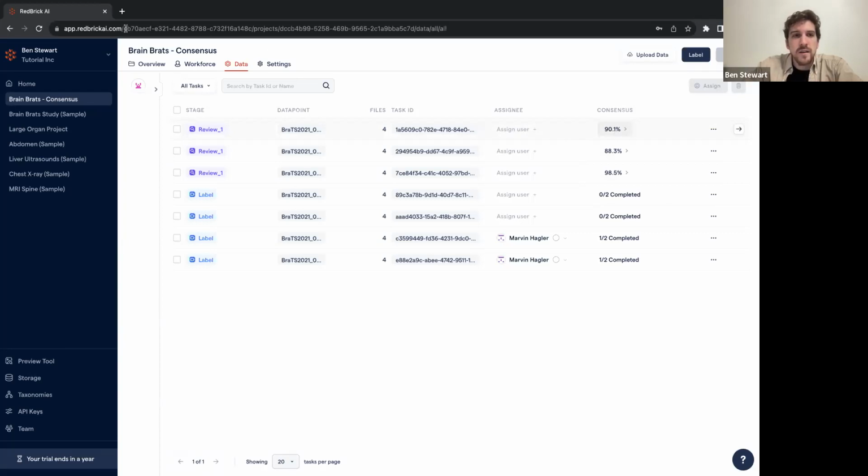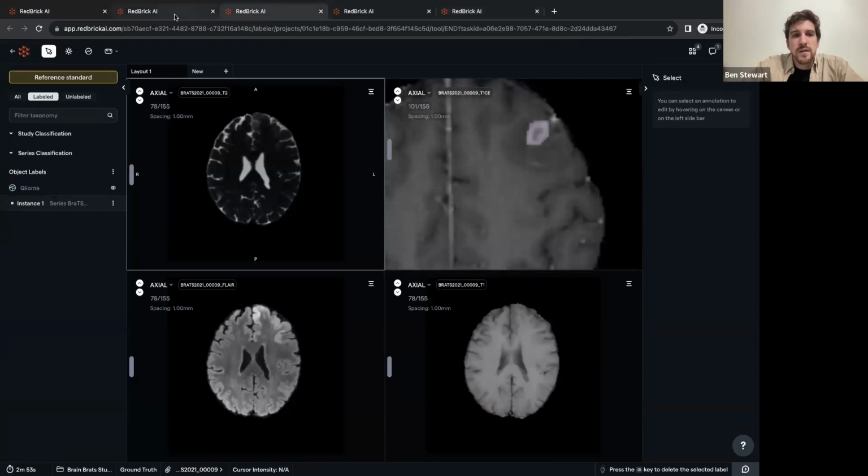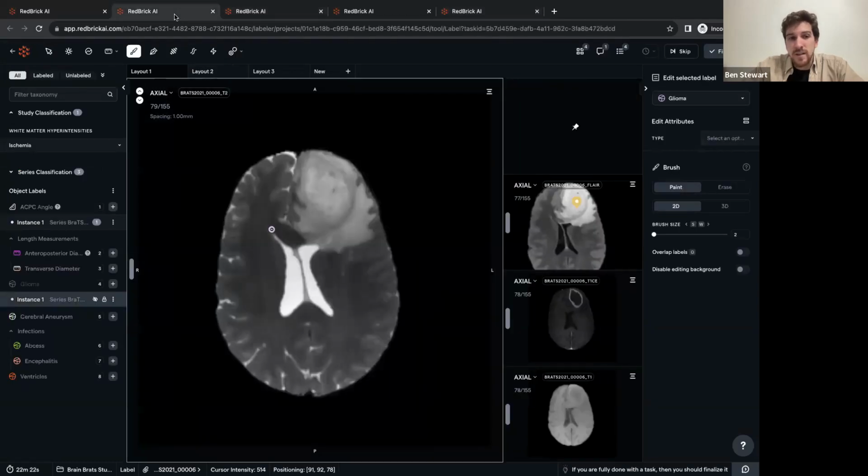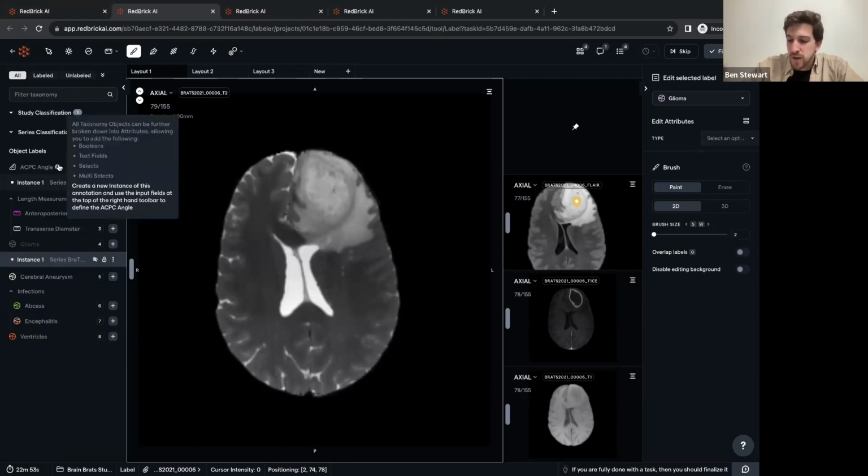Okay. Finally, and we'll wrap this up here, get to the question. What you can do with the Python SDK is a wide variety of things. You've seen evidence of some of these things throughout the platform, right? When I'm talking about metadata, things that can be tucked into places, you can have metadata that's applied directly on a series, as I said here, metadata that is applied directly to a study in terms of instructions. If you need to supply your labelers again with links, images, rich text, you can do all of that here with the help of our Python SDK to make your annotators' labeling experience as directed and guided as possible.